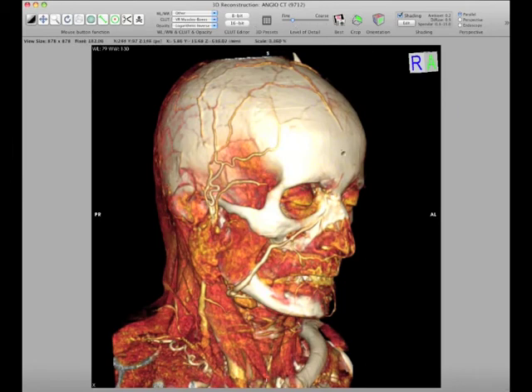The trick is that we didn't move or reposition the image before that. In another demo, we're going to go through and talk about exporting movies, QTVRs, and that sort of thing.